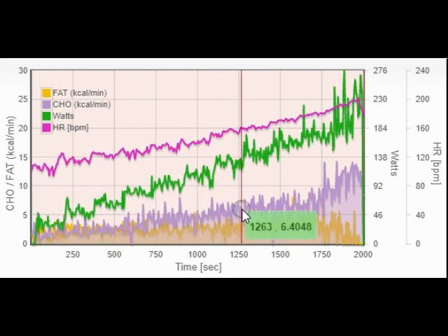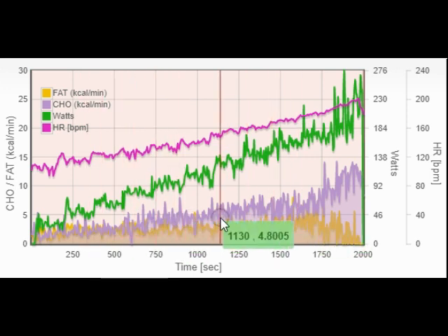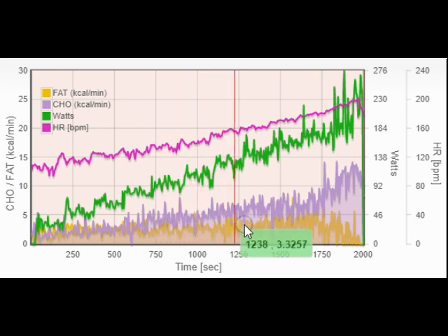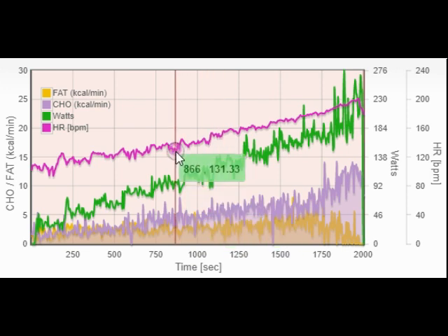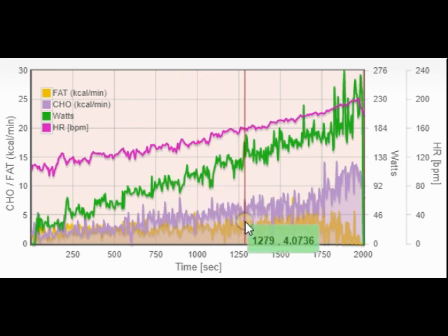That is energy. So the answer is fat is basically non-responsive. In this case, this person I would have to consider sugar addicted, sugar dominant, glycolytically represented, for lack of another word, versus lipolytically or fat represented. The previous video, the person was fat adapted. So we simply want to take this metabolic situation and improve it. We can target intensities by heart rate, intensities by wattage, to start flushing out more fat oxidation, to utilize more fat for fuel so that we have a much better crossover.